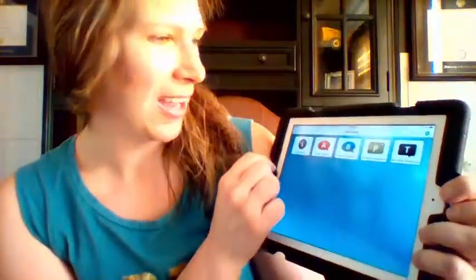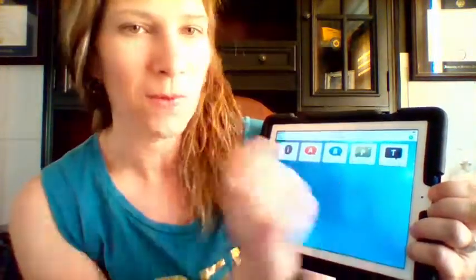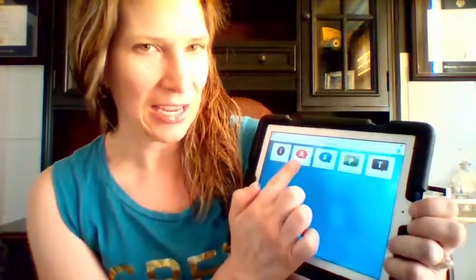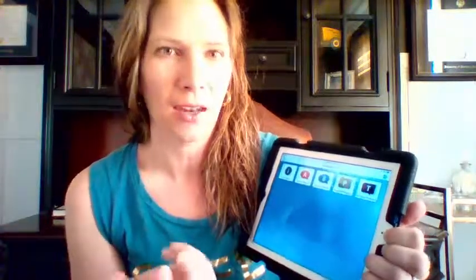When I had said that I was looking for a free app, I thought that I would find a symbol thing with 10 pictures on it, but this really has a robust system. I've got it on one already. So you can actually see there are 4 vocab sets here. There's a Symbol Talker A, which is maybe a reduced vocabulary set. Symbol Talker B, which is the set that I use, I believe is a robust vocabulary, so providing a lot of words. Talking Photographs is interesting.